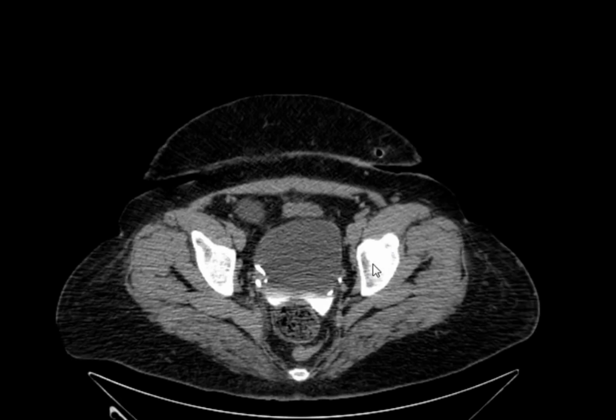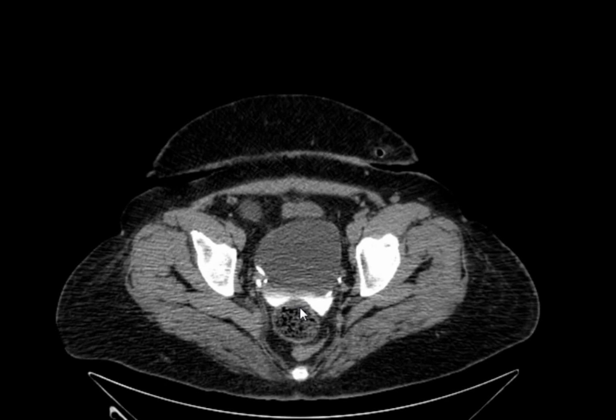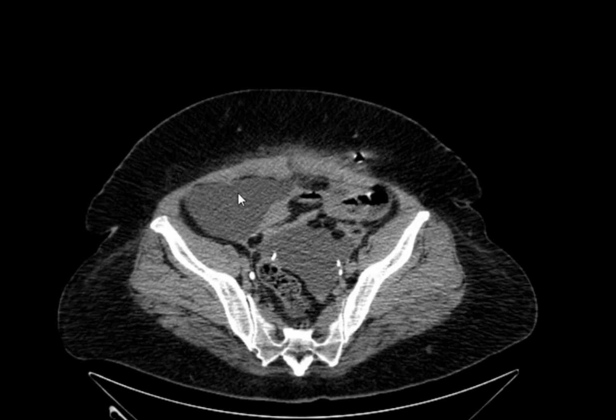Of course, we delay for 5-10 minutes. Contrast in the rectovaginal pouch. Okay, wait for 4-5 hours. It will be even here.